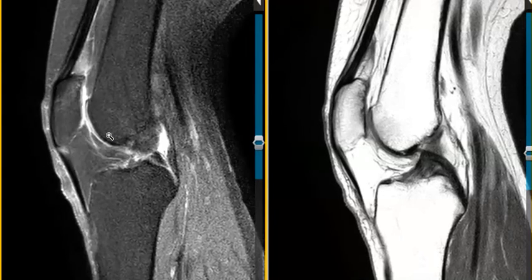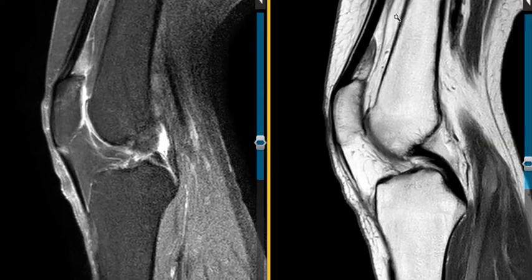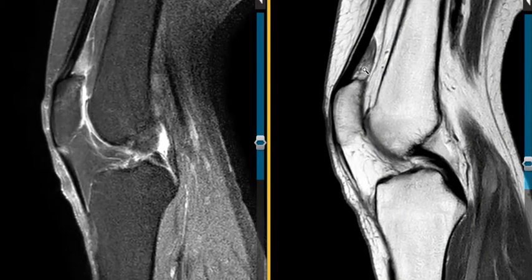And there's one other finding, and we're going to go over a quick anatomy of the fat pads of the anterior compartment. So there's three fat pads in the front of the knee. This is the femur, and right in front we have the prefemoral fat pad, this band here, bright fat, the prefemoral fat pad, appropriately named in front of the femur. And then in front of that, just above the kneecap, we have a little wedge here. This is another fat pad called the suprapatellar fat pad.